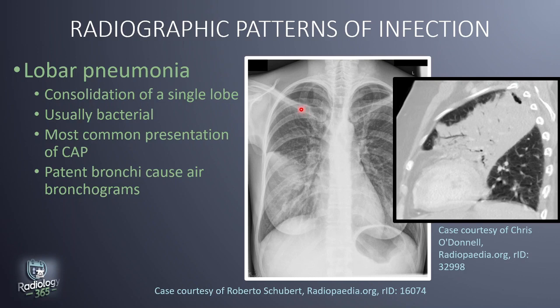So in this plain frontal radiograph, it shows right middle lobe consolidation, and I know it's a right middle lobe because I can see the minor fissure here separating the area of consolidation from the upper lobe. I can also see that the right heart border is silhouetted by this opacity, hence telling me that this is a middle lobe lesion because the right middle lobe abuts the right heart border, hence the silhouette sign seen here. Then we can also see these lucencies within the consolidation signifying air bronchograms. So this was a case of right middle lobar pneumonia.